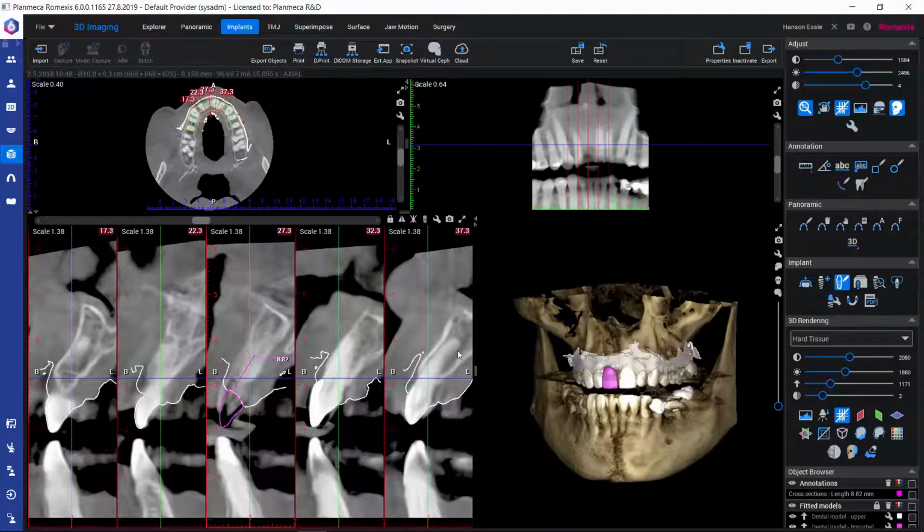So when we activate this tool, we can keep our left mouse button down, and at the same time, like we see when we are defining the dimensions for this generic implant, we can also see those dimensions displayed next to this rectangle. So this tool will produce us always this same kind of generic implant, and it will have the dimensions that we specified while drawing it.